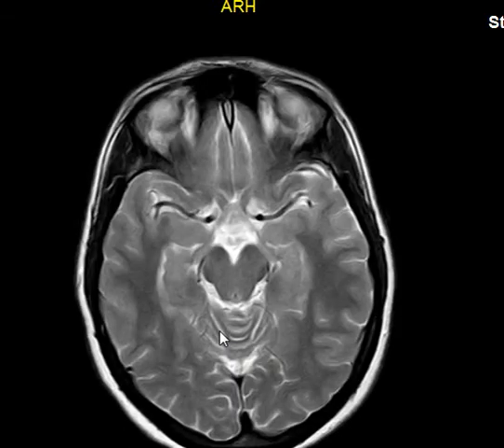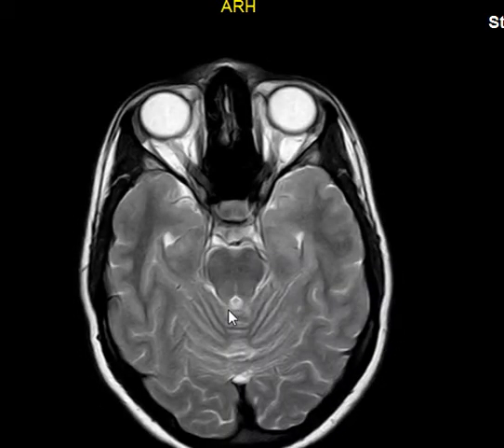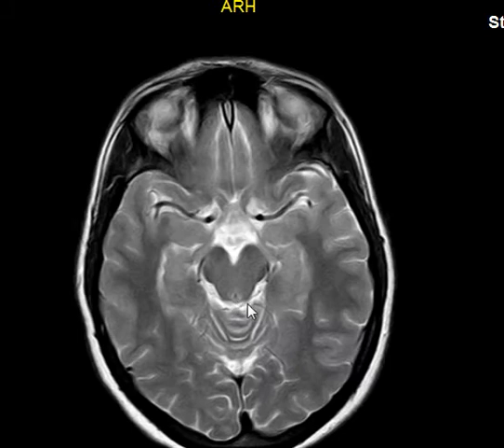Most commonly, the cerebral aqueduct of Sylvius is the one to be occluded, and when it is occluded, there will be hydrocephalus or dilated ventricles. It will usually affect the third and the lateral ventricles, while the fourth ventricle remains relatively normal sized. This indicates that the cerebral aqueduct is obstructed, especially in case of congenital hydrocephalus.